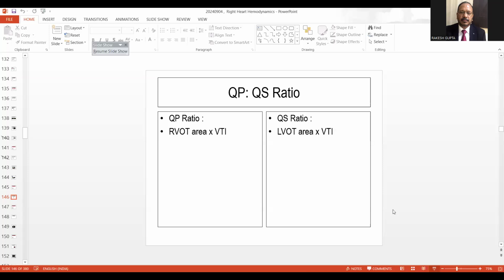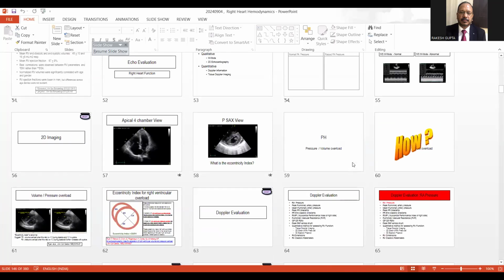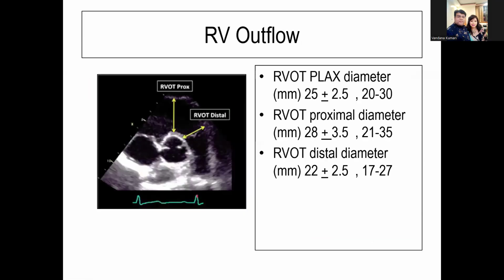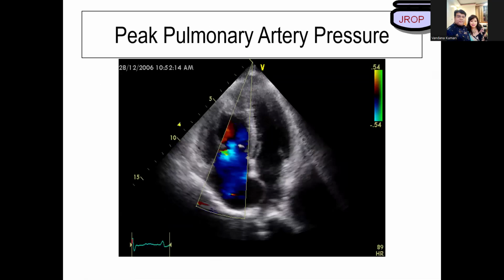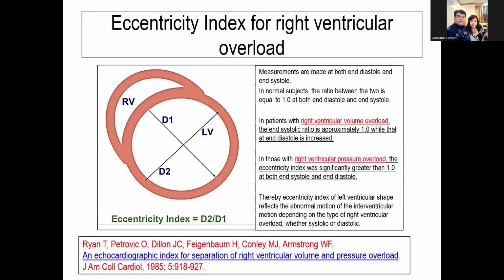Eccentricity, septum motion. This is what the eccentricity index is.